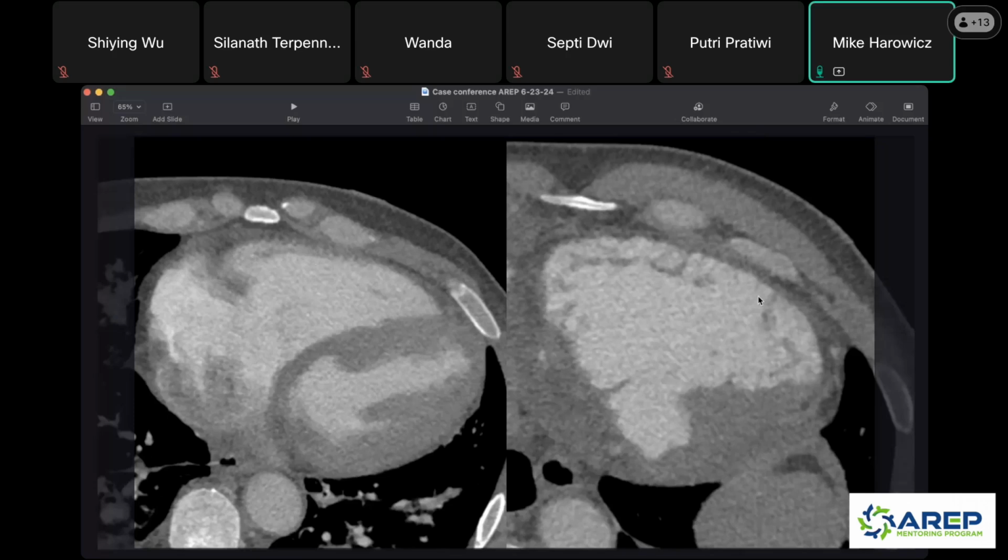And on the right image, this is all your right ventricle, right? Very thin walled, a lot of trabeculations. And this is a part of your left ventricle here. And I think cardiac things can be really tough on just the axial images alone. So what I'll tell people is that, if you're worried about something with the heart, I would be ready to reformat into one of the cardiac planes.